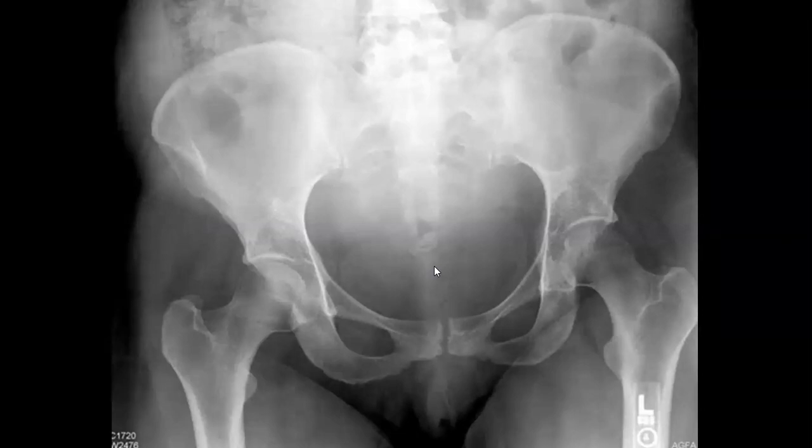Let's go to this case. I think in this one, even in practice, you can see something like this. Again, in any X-ray, you will go to your checklist, and the most important item on the checklist is to see first the fractures. You will see the rings, your rings here, your rings here, all types of rings in the pelvis, as you know, there are many rings. You should follow and see, and check if there is any lytic or sclerotic lesion.